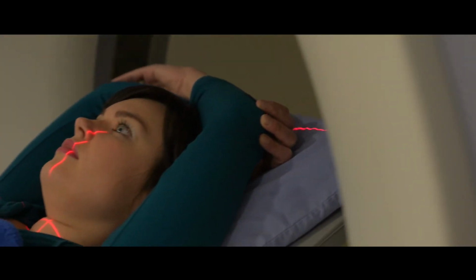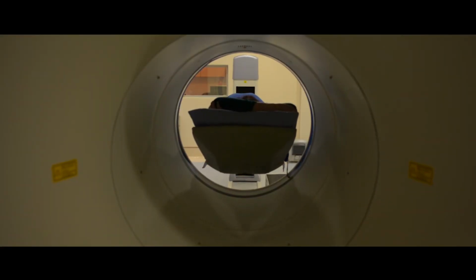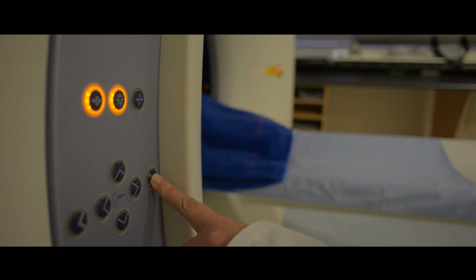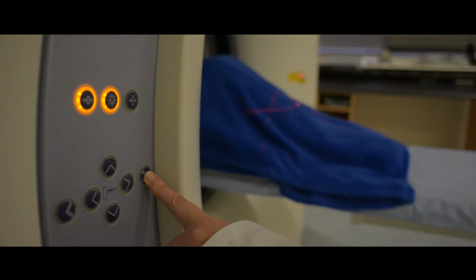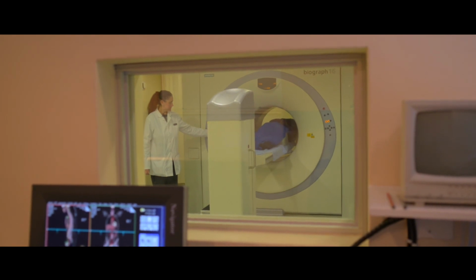The radiation that we use is actually still very low. The injected activity that we give is obviously depending on the patient's weight. We work out what is the injected activity we need to give. It has been proven that just one of these studies wouldn't cause an increase in cancer risk later in your life. The radiation dose gets excreted quite fast again from your system, and you're no danger to your loved ones or anyone at home.